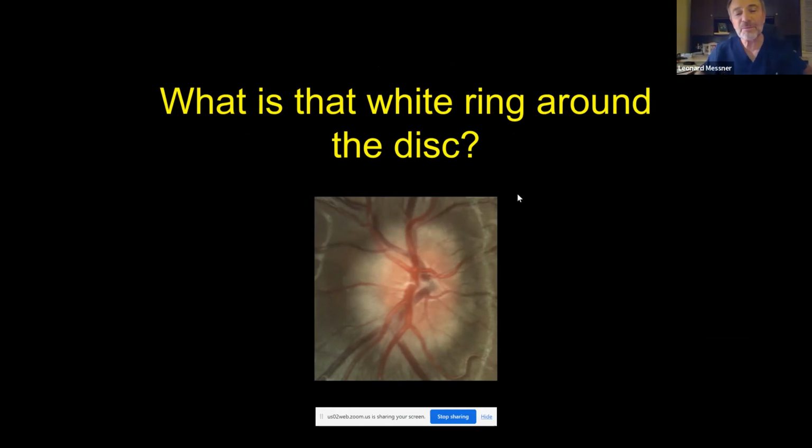You know, that's a really good point, because I just saw a kid the other day that had very, very early disc drusen. Nothing was showing up on the B scan. Nothing was showing up on the fundus autofluorescence yet. There were some equivocal areas within the optic nerve that looked somewhat ovoid, but what was showing up within the optic nerve were the hyperreflective horizontal lines.